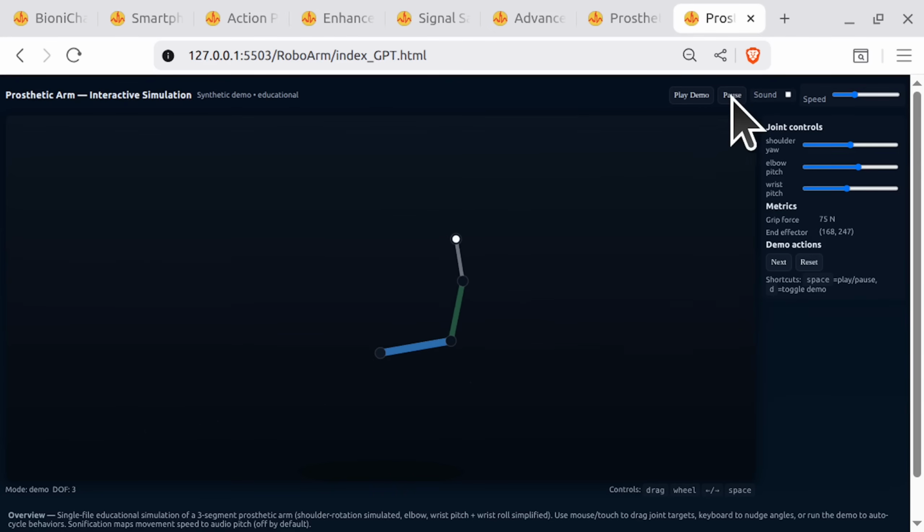Yeah, obviously you don't need 2 buttons for that. So that's kind of nice. The demo is meant to be going through different demo actions. There are meant to be 3, I think, in the code, but I don't think it's switching between them properly. Or maybe it does.